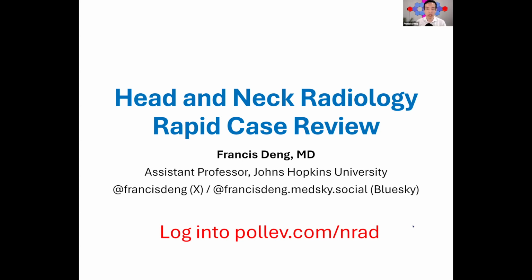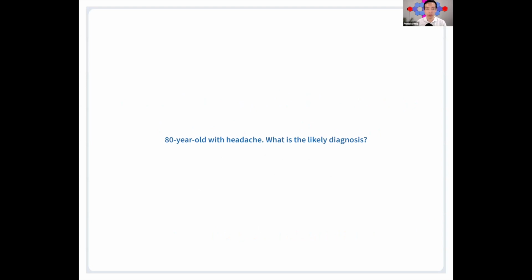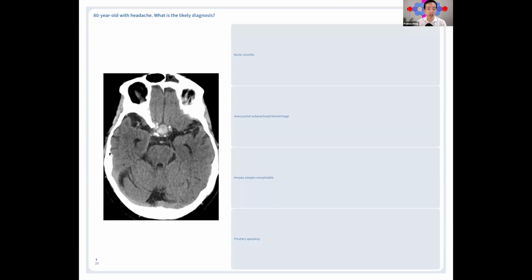So without further ado, let's get started. So our first case is going to be an 80-year-old with headache. What is the likely diagnosis? You'll have 30 seconds for each question, after which I'll review the answer.